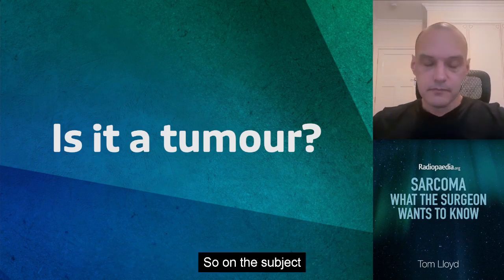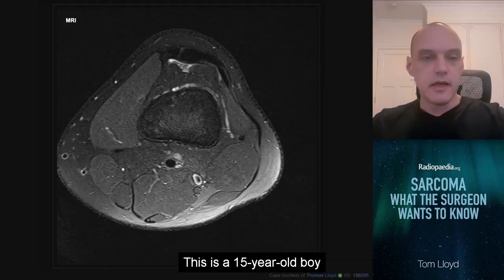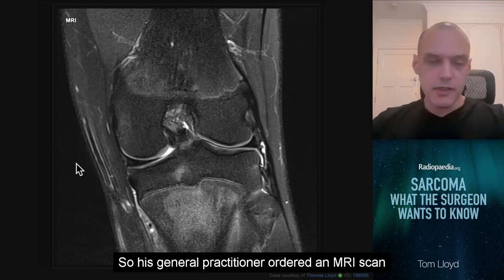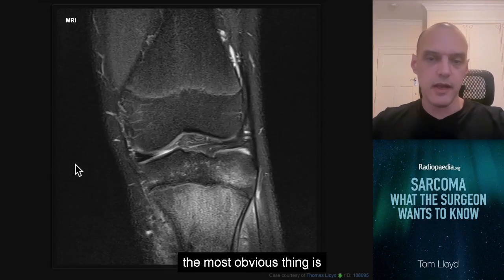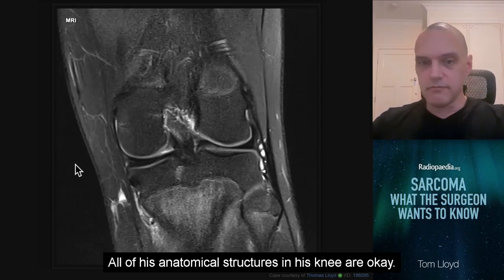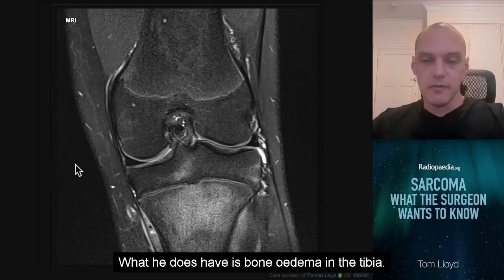So, on the subject of is it a tumour, I've got a case here. This is a 15-year-old boy who has presented with knee pain. So his general practitioner ordered an MRI scan, and just scrolling through it now, the most obvious thing is that he does not have an internal derangement of the knee. All of his anatomical structures in his knee are okay. What he does have is bone edema in the tibia.